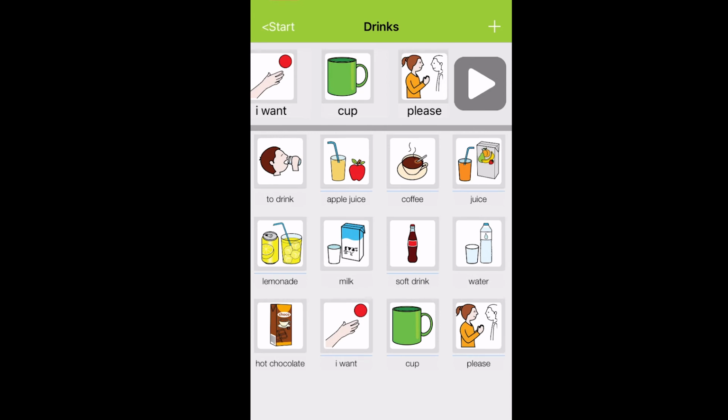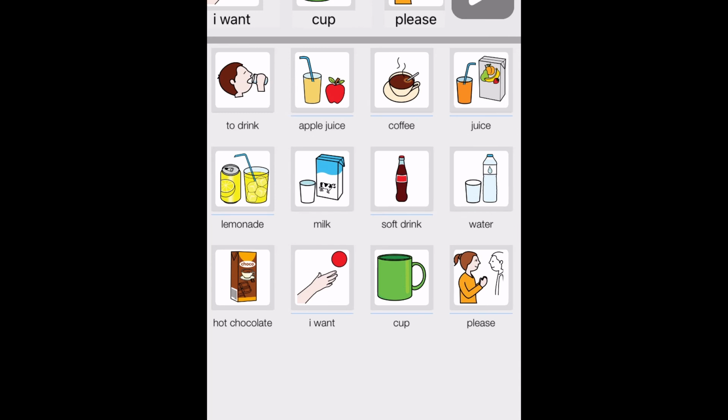But overall, these things can start to become reiterated. And you can use that sentence structure too for toys. I want ball, please. You can use it as a therapist. You could have first and then whatever object. So first puzzle, then ball. Usually it's first, then using first noun, then noun. So first object, then object. So first puzzle, which is an object, then ball or whatnot.